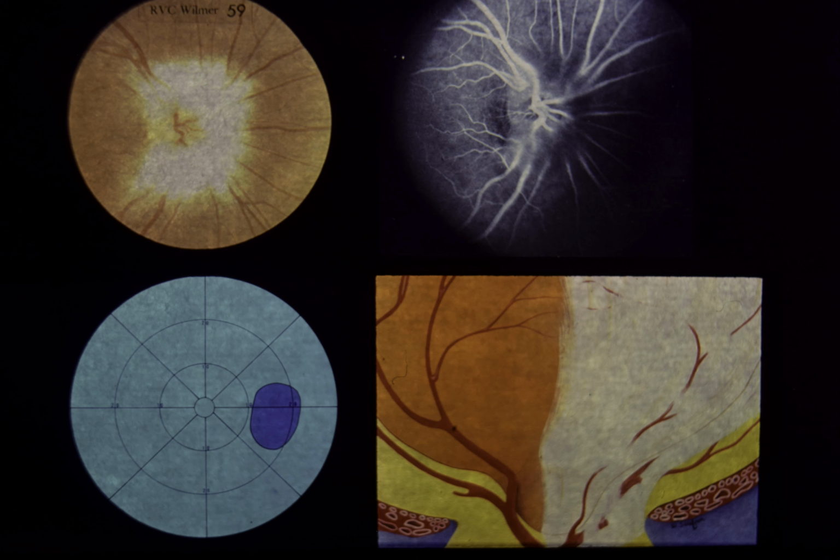Slide 59. Myelinated nerve fibers. This asymptomatic 34-year-old female had 20/30 visual acuity. Upper left, the right optic disc is obscured by dense white tissue in a striated pattern that obscures the retinal vessels as they leave the optic disc.